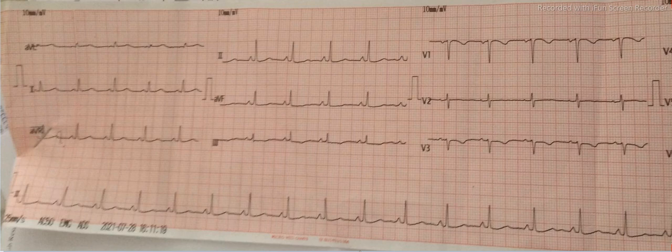So we take a rhythm strip. This is our lead 2, you see here, this is our rhythm strip. If you see two peaked R waves, here is one and here is one, and another one here, and here is one. If you compare, here is one big square box, 2, 3, and somehow 3.5. Similarly here, half, 1, 2, 3. So it seems that they are equidistant.